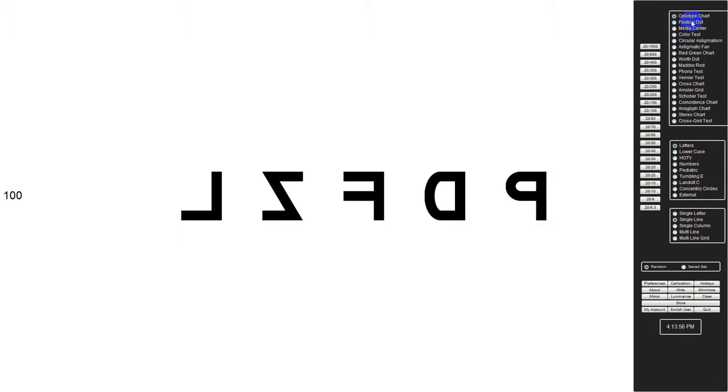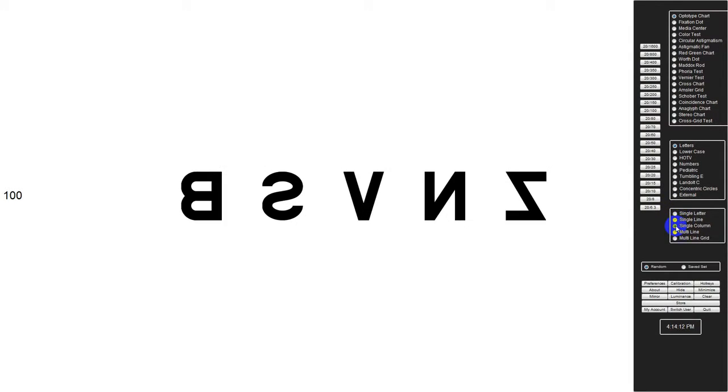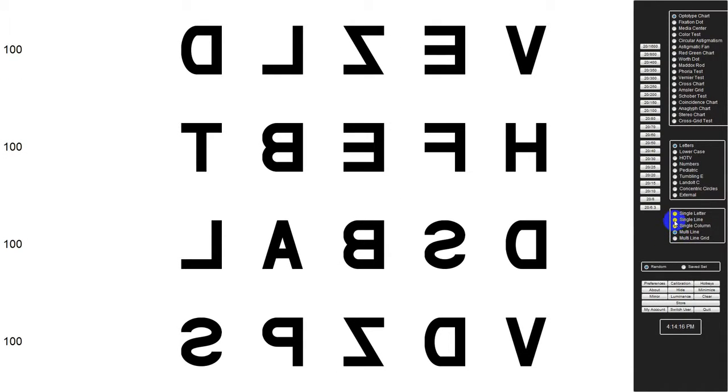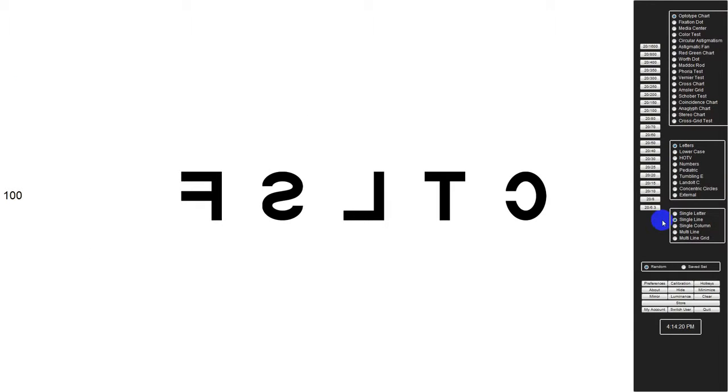This is what do you want to show, and then this is how do you want to show it. Tumbling E's, pediatric, numbers, HOTV, whatever you want to show there. And then if you want a single line, a single letter, a single column, or a multi-line grid. But most people just want to start out with a single line, and that's the default. So your defaults are Opti-Type, letters, single line, and 100. And most everybody does random.